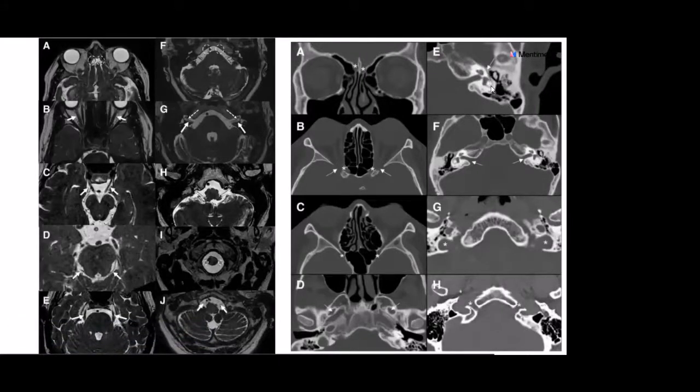Then this one is the facial canal. Actually, this is showing the facial canal. These are the two internal acoustic canals, bony internal acoustic canals. This one is the jugular foramen, anterior to it is the carotid foramen, and then this one is the hypoglossal canal on the CT scan, and you can see how thin and faint it is visualized on the MRI.